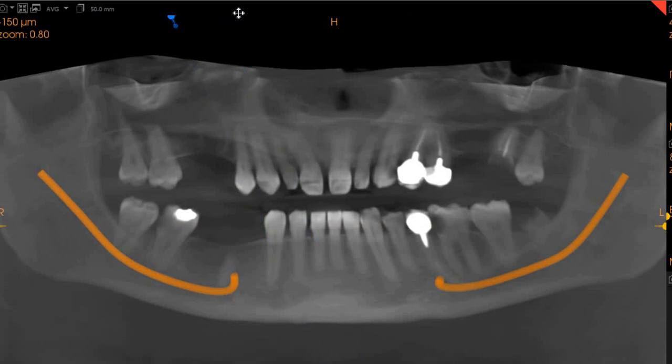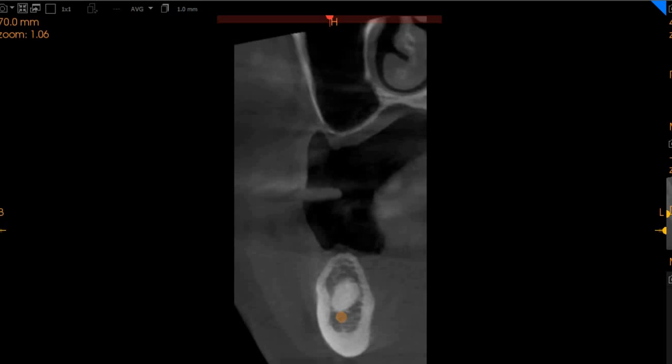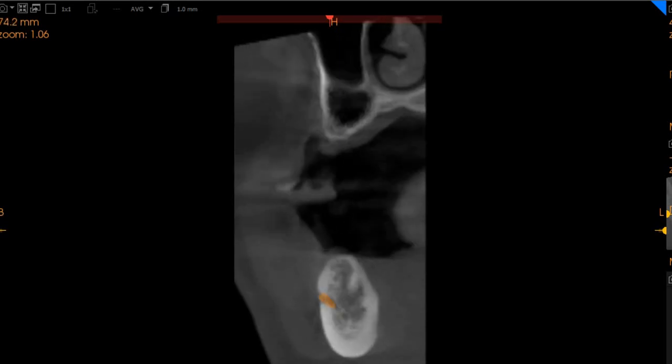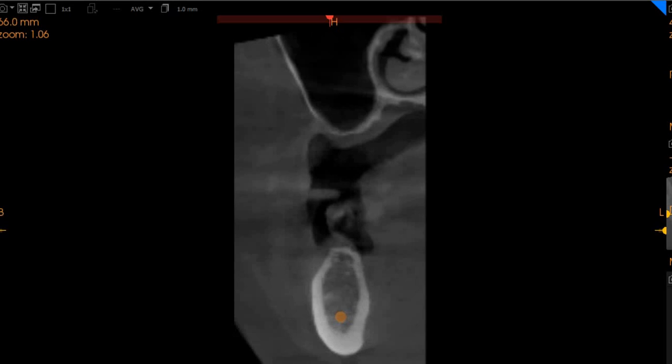The upper right side, the doctor has asked us to place virtual implant, but here implant placement is impossible because of the nature of the bone. We don't have any bone. So until and unless sinus lifting is done, and that too quite significant sinus lifting will be needed because there's absolutely no bone in the region of the 5 and the 6 for any kind of implant placement.